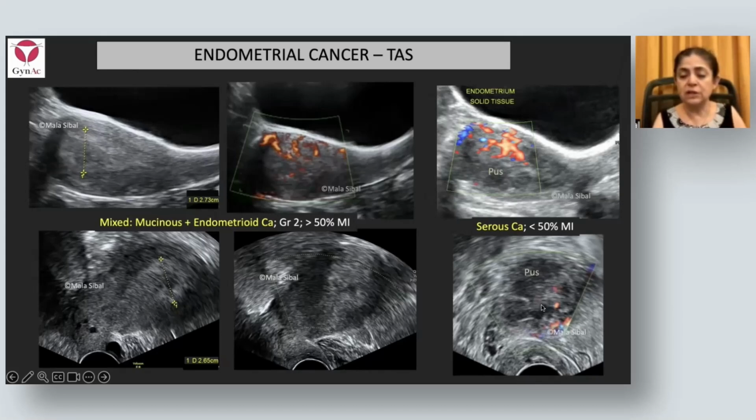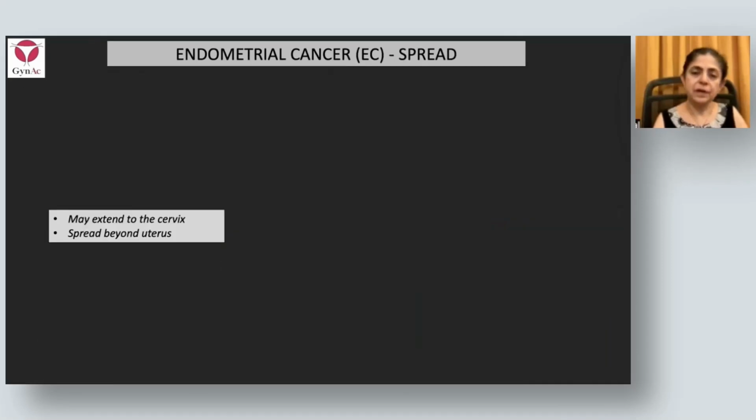Again, another patient on transvaginal scan, she had pus in the endometrial cavity, and pus is thick, hyperechoic, so you couldn't really see the outline of the solid tissue or confirm. I managed to see some flow within this tissue, but if you see the transabdominal scan, it gives you a much better evaluation. You can see the solid tissue with significantly abnormal vascularity.